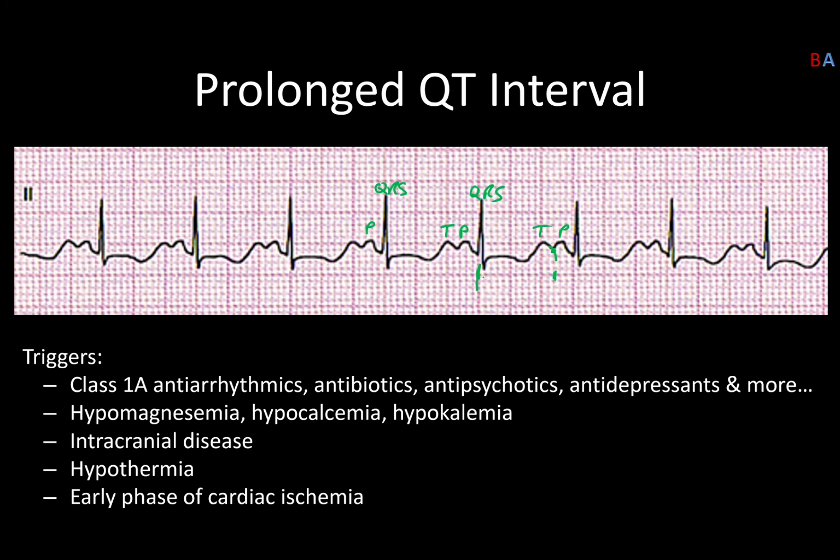So this space through here, that's about 5, 10, 11, 12. So that is 12 spaces. It's 12 small boxes, sorry. So if we take 12 times 0.04, we get, and yes, I actually have my calculator out just to make sure that I get these numbers exactly right for you guys.